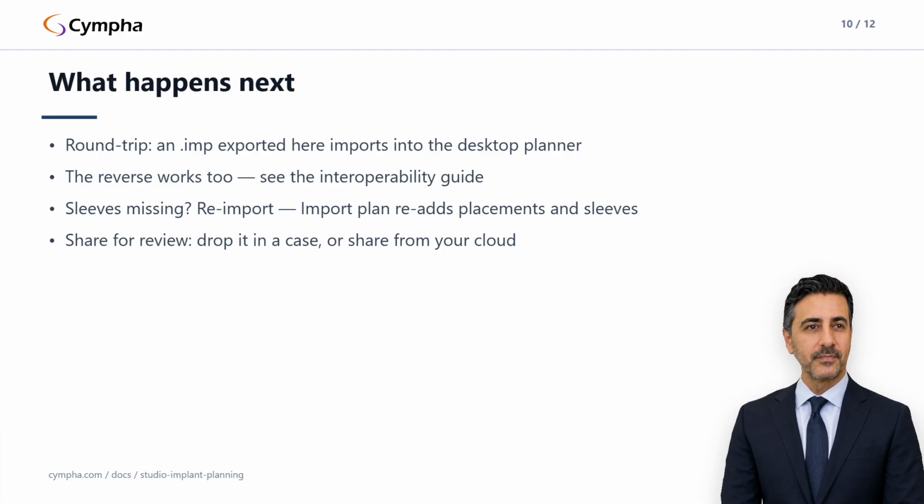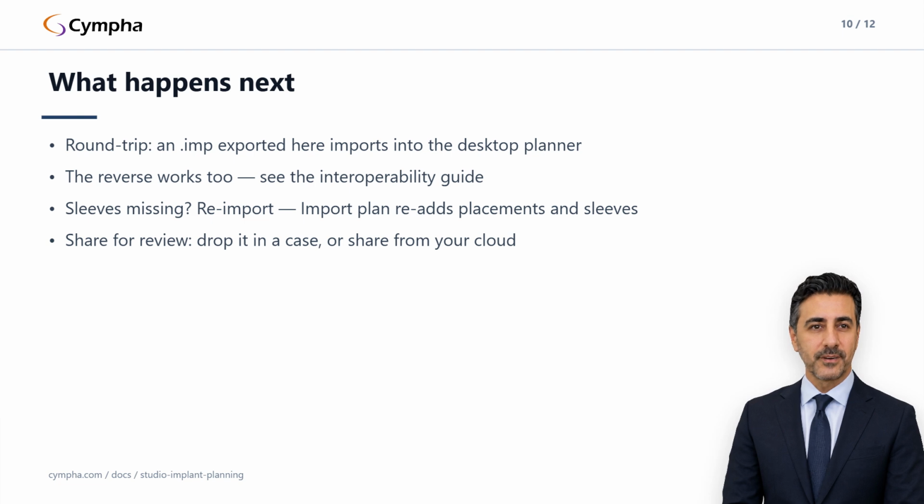First, the implant icon on the left strip is grayed out. That means no DICOM CT is loaded. The icon is gated on the volume. Remember, use the hamburger menu's Open DICOM action or open a Cloud CBCT in a studio and wait for the slices to actually render before clicking the icon again. Rendering, not loading. The wait is short, but it's real.